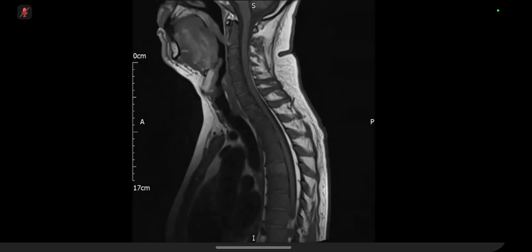So on T1 weighted imaging, I can see a diffuse marrow abnormality in the vertebral body. So what is your concern? So in a 45-year-old patient, I'll be concerned that it may represent a malignant process such as... Excellent. Go to the STIR, please.